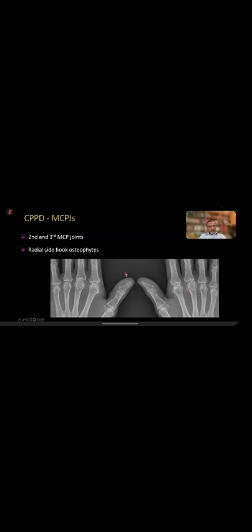And what else did we say in osteoarthritis? STT and first CMC joint can be involved, but radius scaphoid is spared. So radius scaphoid is involved in CPPD. So there are two signs you learned that you can use to easily separate it from osteoarthritis. Okay, another example. But now we can see that there are osteophytes in the fourth and fifth joints as well. So what is this? Is it still CPPD or something else?